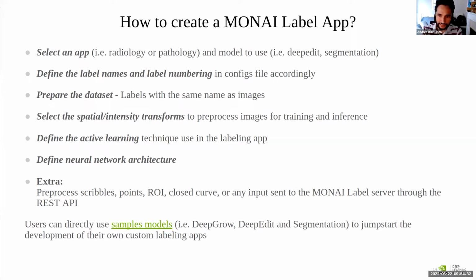The second bit is we need to prepare the data set, right? Are we working with DICOM images? Are we working with NIfTI or NRRD format? How are my images? How many images do I have? Can I use a file folder? Am I using DICOMweb, where I'm hosting the server, basically, and where I'm putting my data set? So you need to organize the data set accordingly. MONAI Label basically manages the data store. I'm going to show you how you should organize that.